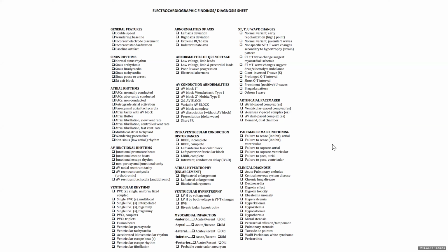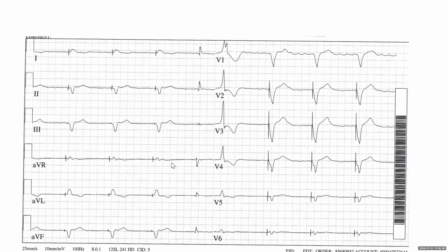Is the intrinsic beat junctional or ventricular? Yeah, this one. That's a very good observation. But is it actually an intrinsic beat or a PVC? Hard to know. So definitely for the exam, I wouldn't say anything. In real life, you would have to have the baseline ECG to compare it with. This could be an escape, yani a conducted beat that came earlier than the paced beat.